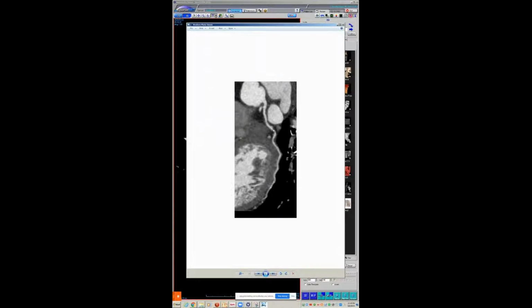It looked moderate. I measured it, even though our software measuring tools are not great, and I kept getting 50, 60% stenosis. We always classify stenosis measurements by percentage, but that doesn't mean hemodynamic significance. We can get hemodynamically significant stenosis starting at 50%, although it's quite uncommon.